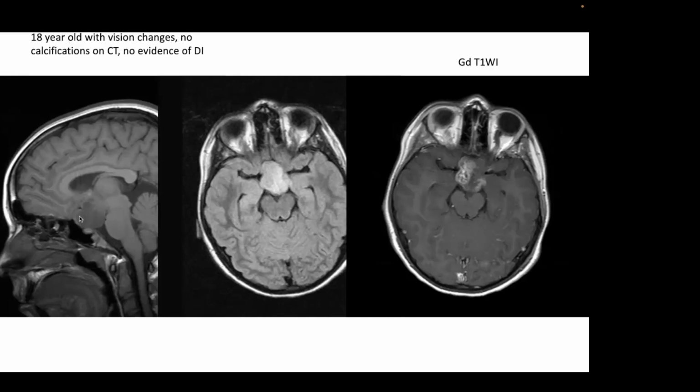So in this case, this proved to be a pilocytic astrocytoma. A CT scan was done. This was not enhancing. There was no calcifications. And so this went to surgery, and this proved to be a pilocytic astrocytoma.